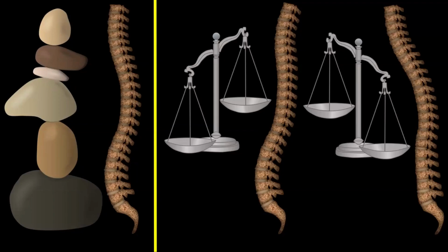And I'm not just talking about the sagittal plane. All the time, I tell my fellows, remember to look at the coronal localizer, because a lot of times it's a scoliotic curvature that may be causing pain. In fact, edematous changes you may see of the end plate may be related to abnormal mechanics from a scoliosis rather than simply disc degeneration.